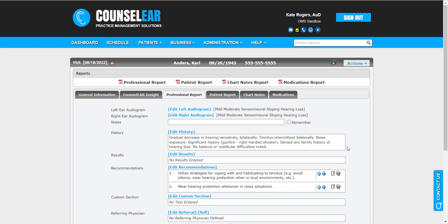Welcome to the counselor overview for entering otoacoustic emissions information into the professional report, as well as managing the OAE settings. We'll begin by showing how data can be entered, and then we'll show how these specific OAE frequencies can be modified by default in the system.